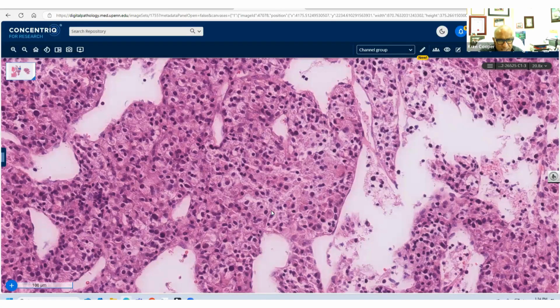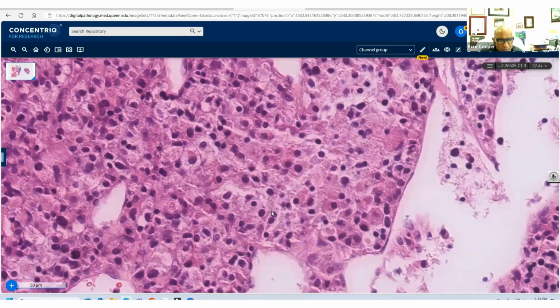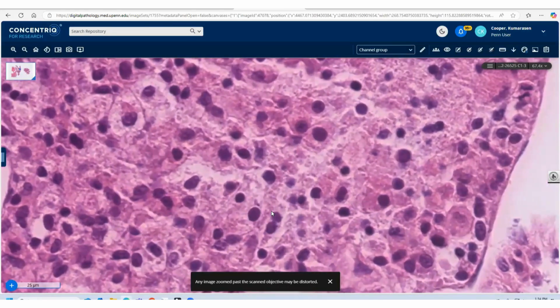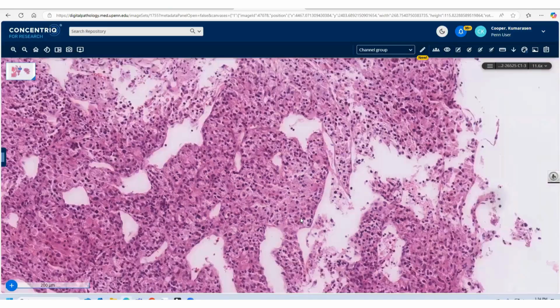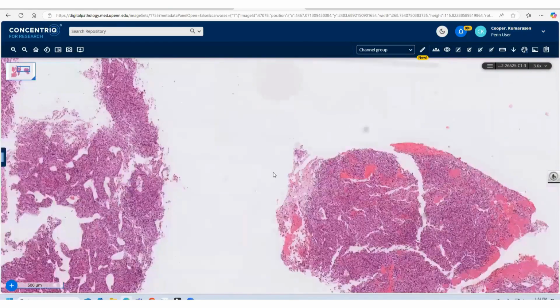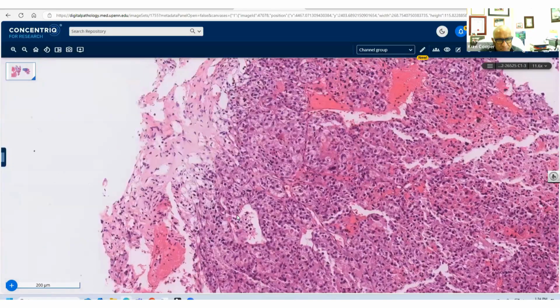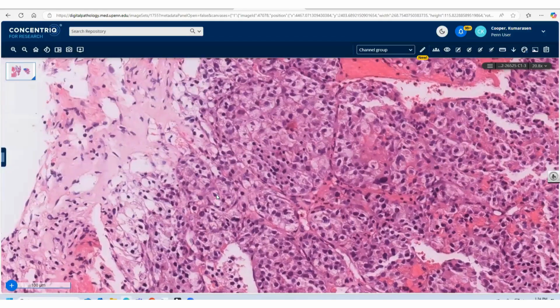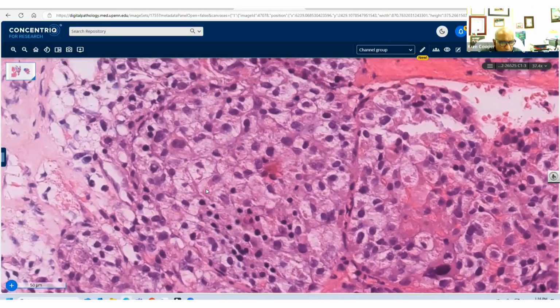But here you can see the cell type. Depending on what the imaging looked like, I think you'd still have to do, I would do the pituitary transcription factor stains. They have an awful lot of granular-looking cytoplasm, eosinophilic to granular. Does it point to any particular pituitary tumor subtypes?